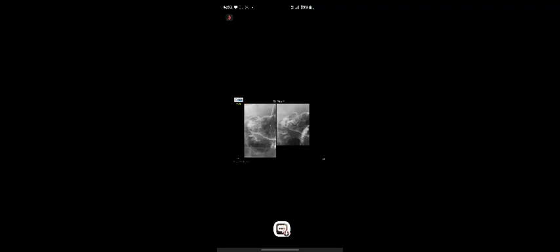If you see here, this is an ulcer. There is a crater. This crater has barium inside. And then there is edema. The edema is a mound of edema, which is not coated with barium. So this is a classical aphthoid ulcer. There is a bit of differential diagnosis for aphthoid ulcers. Aphthoid ulcers can be anywhere in the GIT.